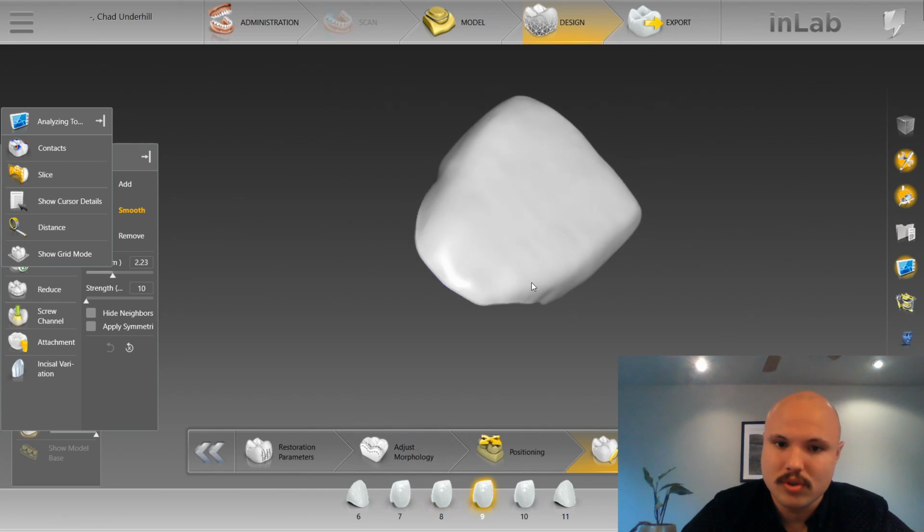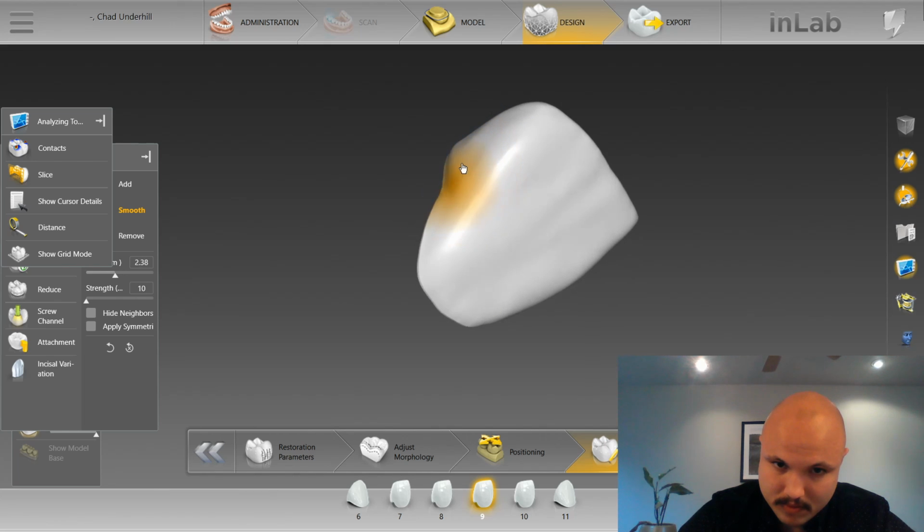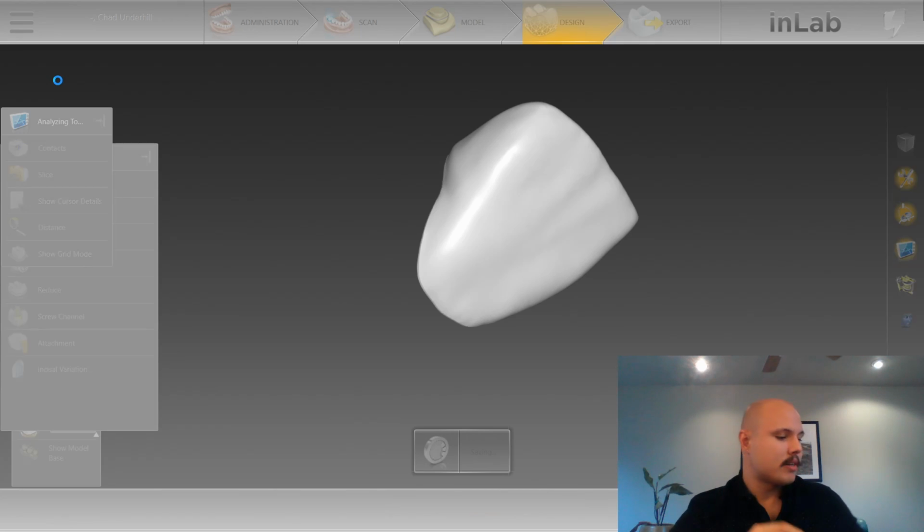On to the next central. Let's save our work so we don't lose anything. And I need to check my phone.